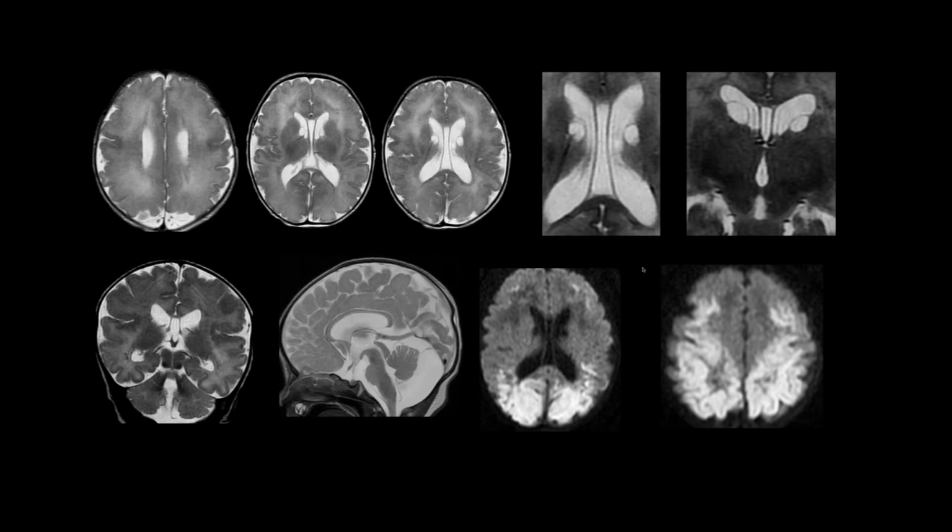I think we will have to think a little about this case because there are not just posterior changes, there are anterior changes as well, which could all be hypoglycemia related. But I don't think all are hypoglycemia. Maybe there's a component of hypoxia. Yeah, exactly. Maybe the mother was not feeding this child and they were having subclinical seizures or something. Seems to be, but hypoglycemia can affect the whole brain. It doesn't have to be posterior only. It's a mimic. Yeah.